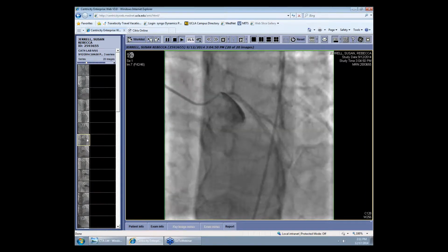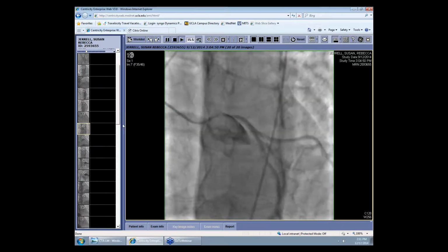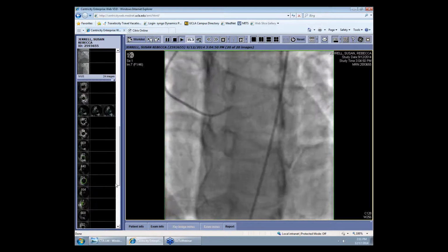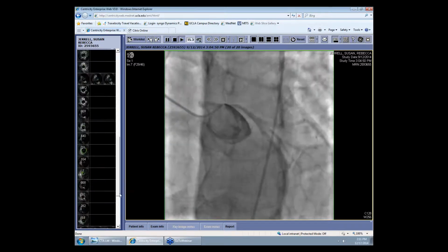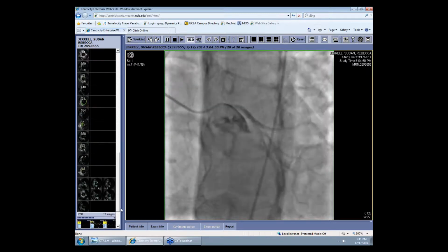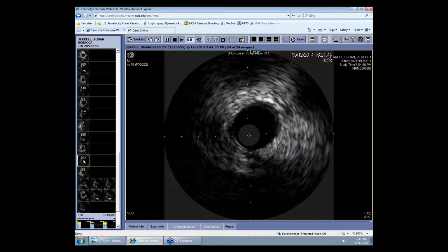And the problem is they use the volcano system, and the imaging is really poor. I can show it to you, but I'm not sure that you can make any sense of it. Let's see which one. I think this one.